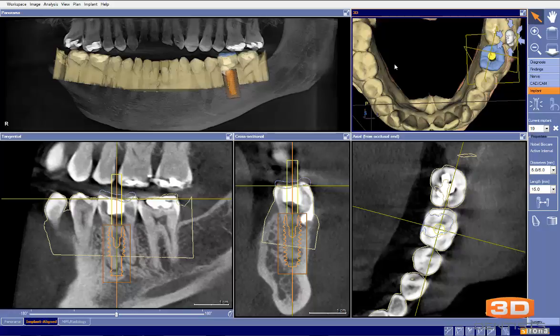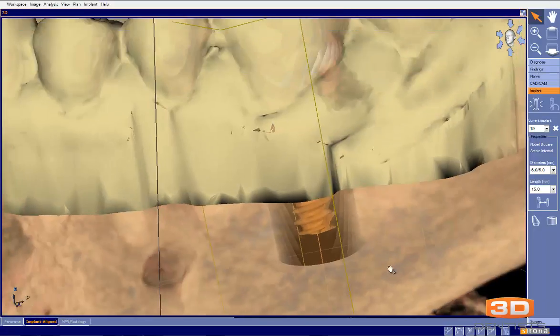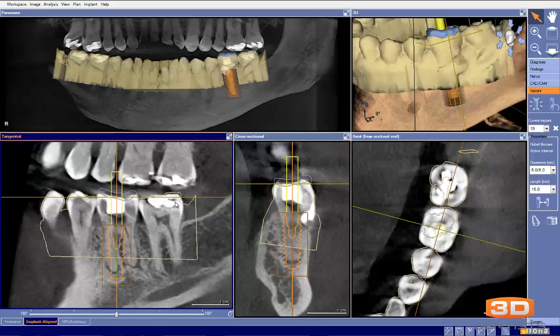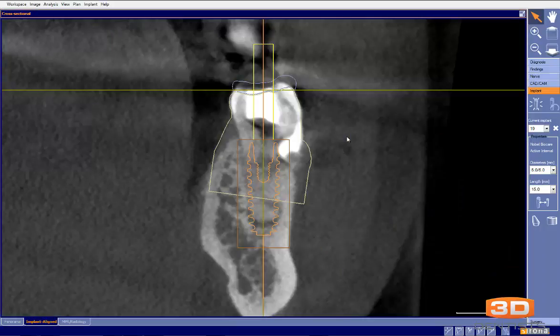But it does happen. And then two other concerns that I see: based on this CEREC data here, I can see that this tooth has recession, and typically where there's gum loss, there's also bone loss. So I'm concerned about our buccal plate height and then our buccal lingual positioning here. If we walk through everything here, our buccal lingual positioning is the first thing that sticks out to me in our planning.